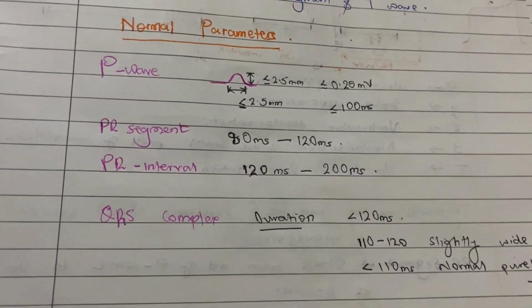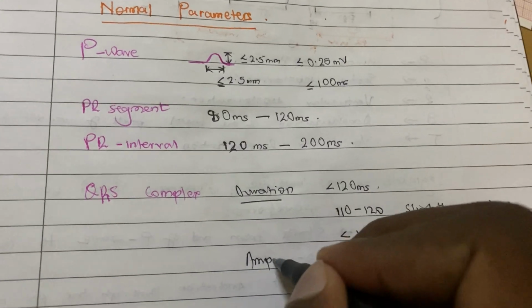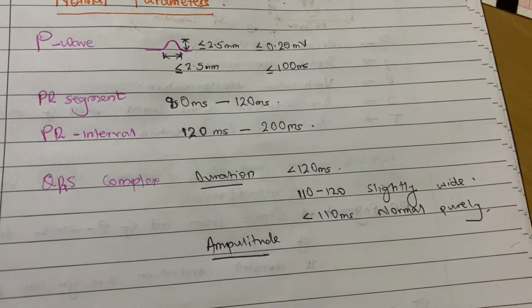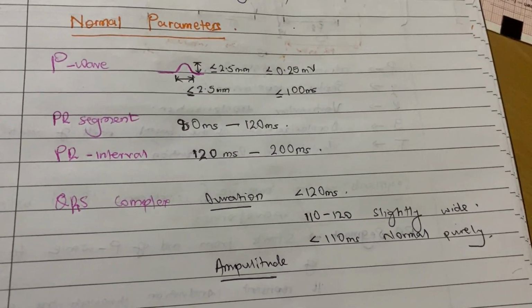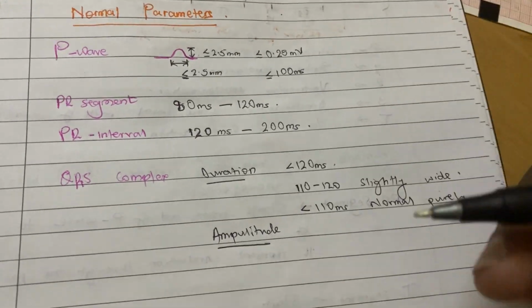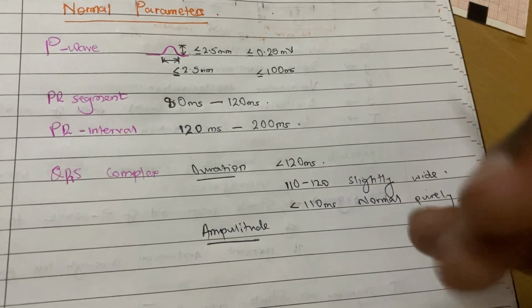Then Q waves. We said Q waves, if they are there. Okay, amplitude. Wait, that was duration. QRS complex net height, it can be positive or negative. If an S wave is present and an R wave is present, then the total: if the R wave is two big boxes and the S wave is one big box, the total is going to be 3 big boxes.